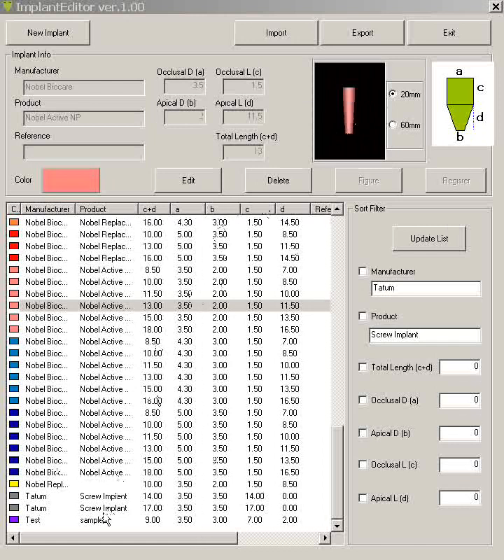So here we have a couple of entries from the previous file I showed you that you could input. You can also have just test ones, okay? If you just want sizes that you know you wish to have, and you don't even wish to name them from your manufacturer, you can do that too. So let's go with the process and show you how that's created.